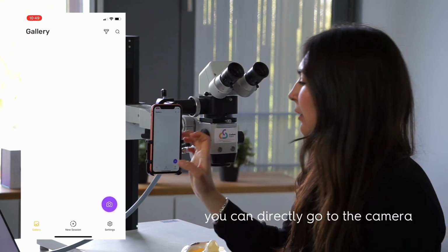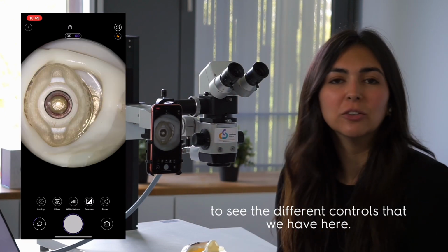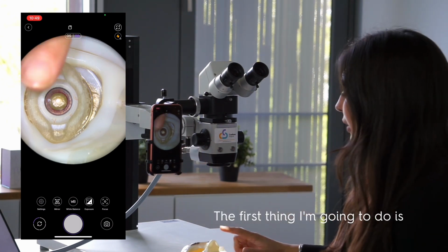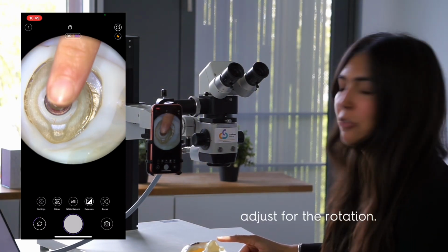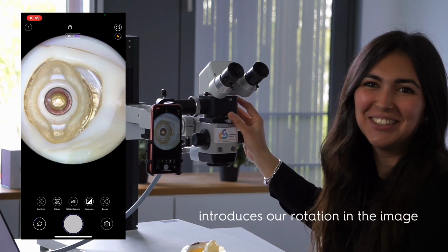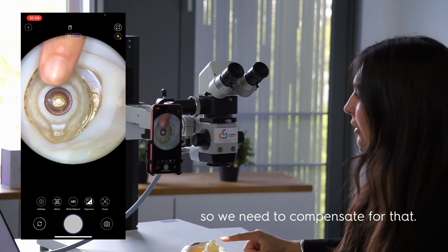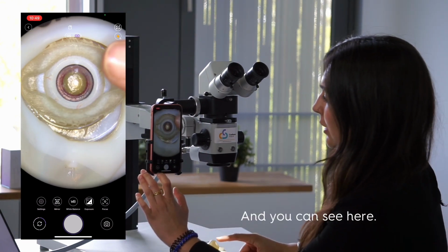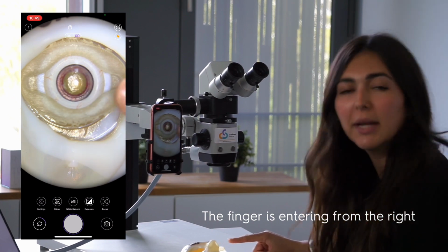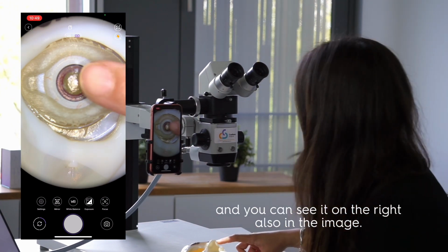So you can directly go to the camera to see the different controls that we have here. So the first thing I'm gonna do is adjust for the rotation. So the beam splitter introduces a rotation in the image, so we need to compensate for that. And you can see here, now it's perfect. So the finger is entering from the right, and you can see it on the right also in the image.